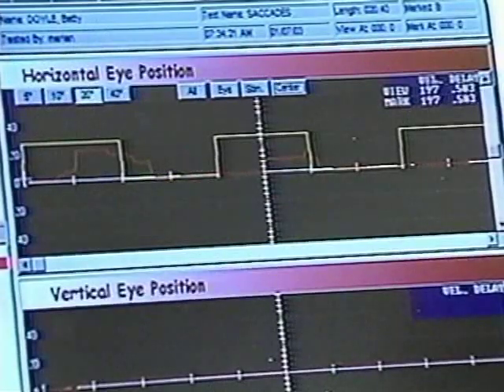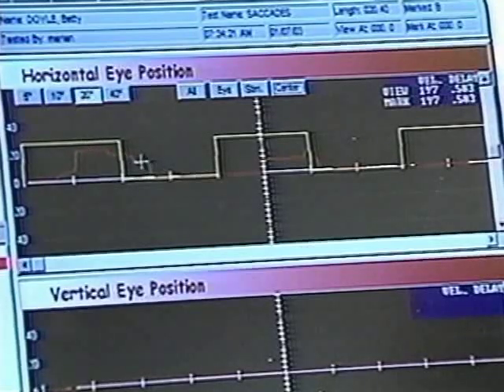In this particular tracing, we see the normal saccadic testing patterns as outlined in yellow, demonstrating again the large, quick-moving targets, as well as the patient data demonstrated in red. In this particular situation, we are seeing abnormal saccadic tracings, which consist of overshoots, of saccadic intrusions, and in fact some glissade or small catch-up type movements which are also abnormal.